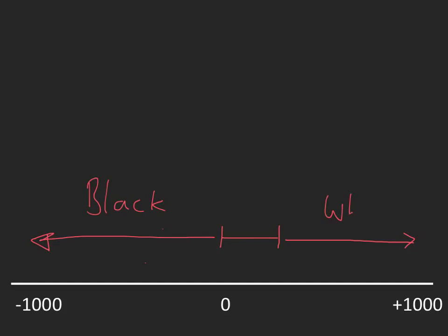Now, when we have a specific window, for example here, we'll come back to that soft tissue window, everything that has a density that is less than that bottom number of Hounsfield units is going to be black on the image, and everything that is greater than that top level of the window shown is going to be white. So you really can get very little diagnostic information from these ranges of densities. All of our diagnostic information is going to be concentrated right here.